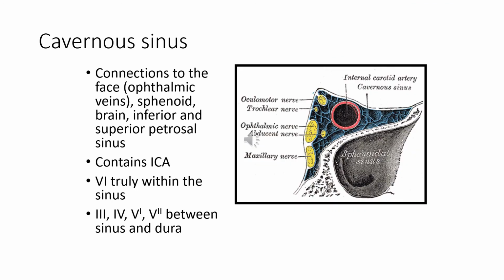This is a cartoon from Gray's Anatomy showing the important structure of the cavernous sinus. We have seen this already on some of the previous axial CT slices.